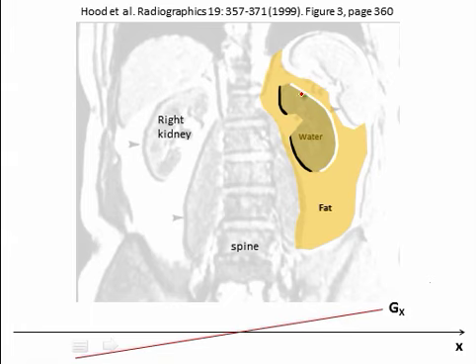It's bright because you're getting signal from the fat and the water, or the apparent spin density here has been increased. Now, as fat moves away from the water object, you get a signal void, which is indicated by these dark bands here, because the apparent spin density in these areas has gone to 0.